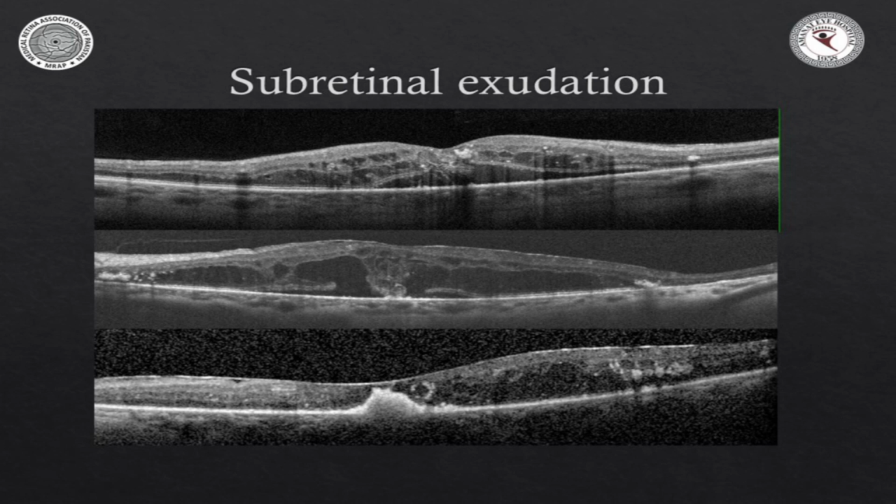अब इसको आप जो कर लें, ऊपर photoreceptor degeneration भी हो गई है और वो subretinal space, वो lipid जो है वो नीचे जाके deposit हो गया. This will not go away with anti-VEGF. So this, for me, I don't even try, right? So you have to realize that this person with a subfoveal subretinal hard exudate is not going anywhere as far as the vision is concerned.